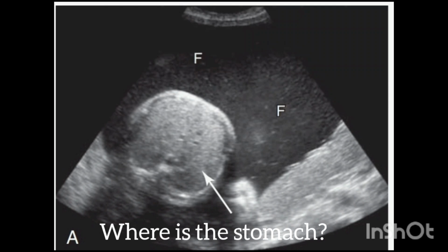Hello friends. During an antenatal ultrasound scan, if the stomach is not visualized, you should rescan the patient after 20 minutes and see if it reappears. After 20 minutes, if it does not appear, then it is a reason for concern. So what causes non-visualization of the stomach or a small stomach?